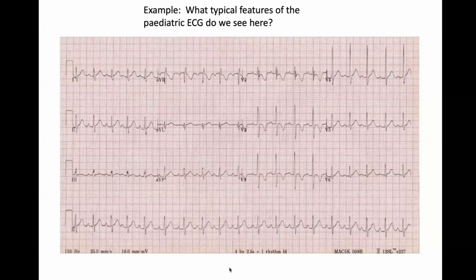Hi, I'm here. What do you think? Just right off the bat, I do see some inverted T waves in V1, V2, V3. I think you said those ones are all normal in certain ages. Yes, very good. I'm not sure what else.